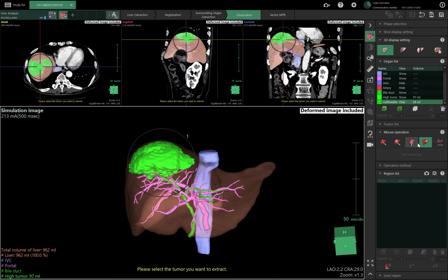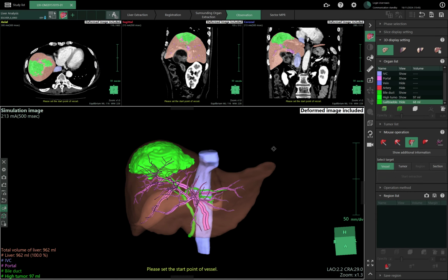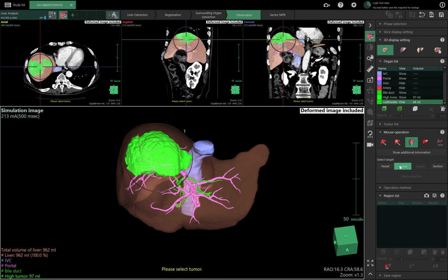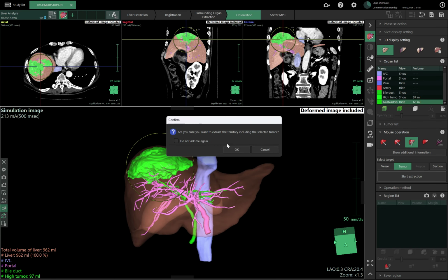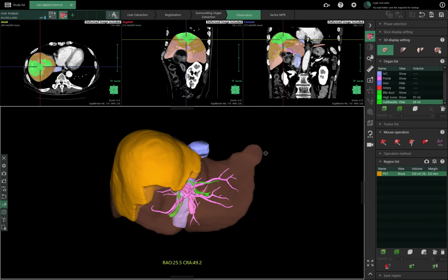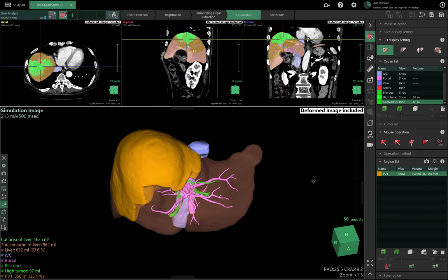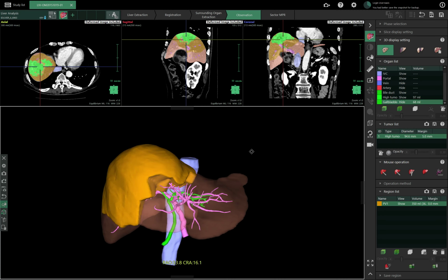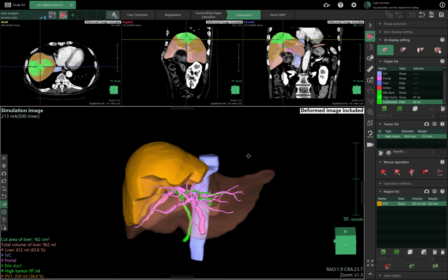Here we will have the possibility to select, for example, the portal, and the target of the region I'm going to extract will be the tumor or the vessel. For example, if I extract the tumor here, now it will look for the vessels that are at some distance, as happened before with the lung, in this case 5 millimeters away from the lesion. Okay, so we will have more or less the same that the doctors will look for. So this could be somehow interesting for them.